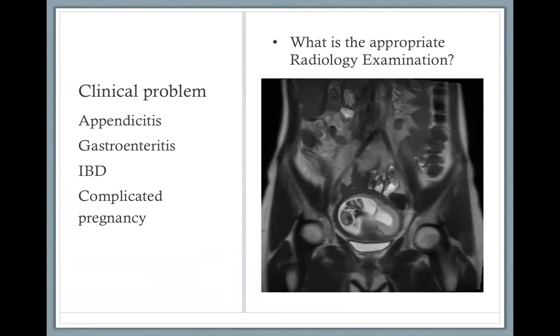So ultrasound is good for acute appendicitis. Now, in a pregnant woman, if she is in early pregnancy, like this one, you can always start with ultrasound. And if you see the appendix and it's abnormal, you have already made the diagnosis. Sometimes the appendix is not seen well, especially when the uterus is larger because it displaces the appendix. Then you revert to MRI.